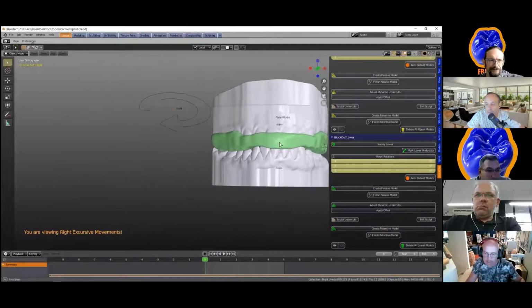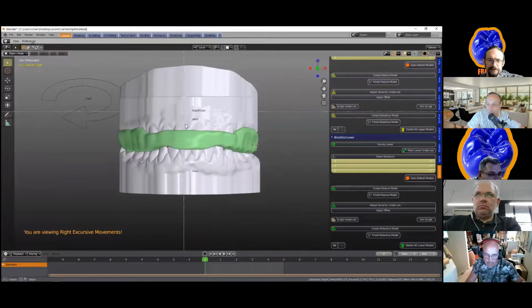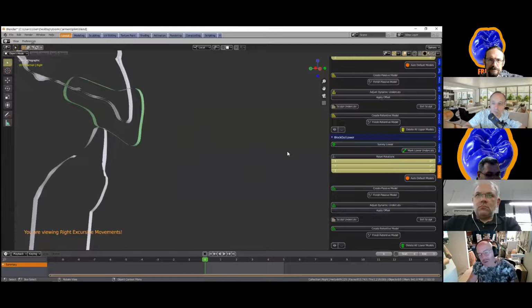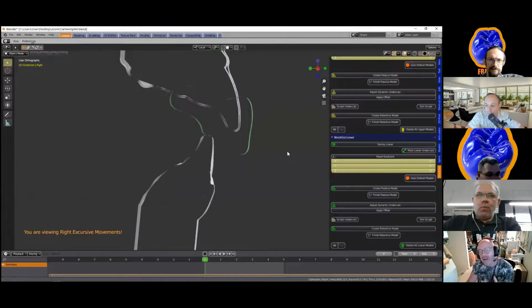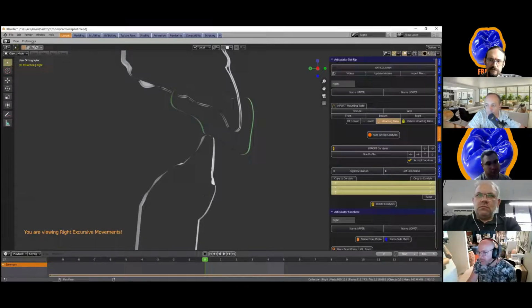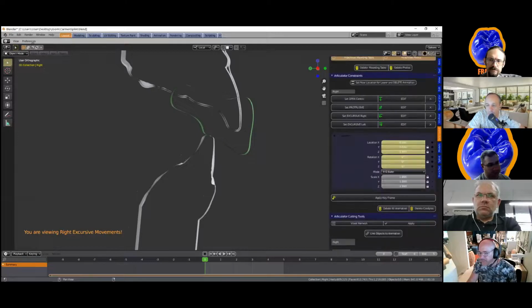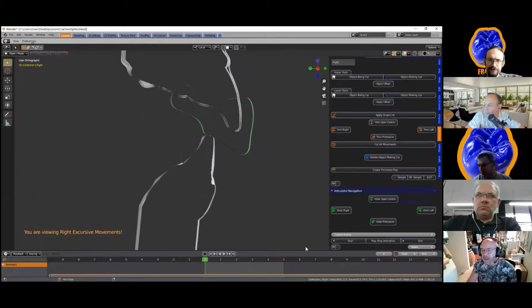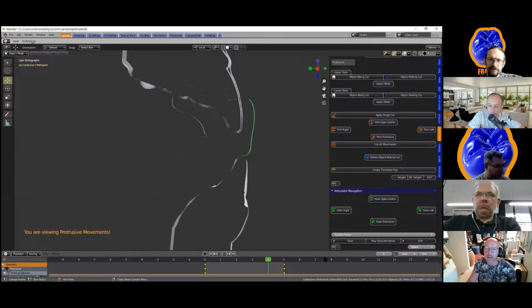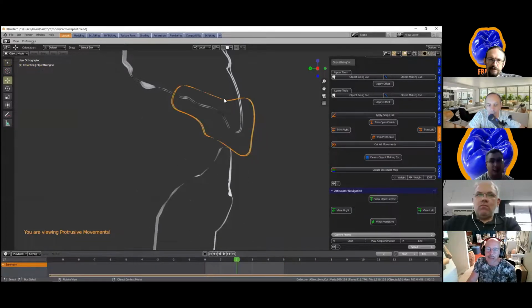Even in the anterior section, if we look at this from the front side, we can see these angles relate to the condyle eminence, that blue object earlier on where we've set the angle. This would be the exact angle that the condyle, the TMJ joint, would actually move downwards. So let's look here: 33 and 15, and that would be 1 millimeter Bennett. That's the 33 there, like that. Okay. You can see the inside of it hasn't been cut out.